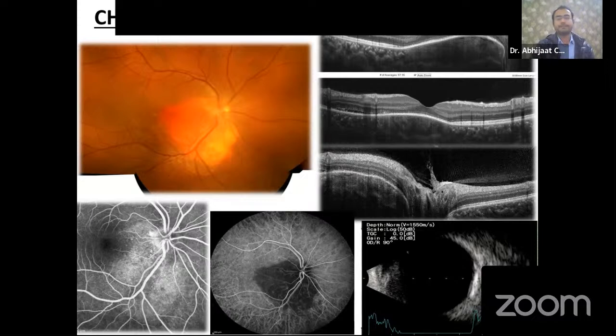staining in the late fundus fluorescein images, and calcification was also seen over the disc, and this large hypointense lesion just juxtapapillary to it. And on B scan, it showed a calcified lesion with presence of a pseudo-optic nerve sign. And since the patient is a young female and the lesion is unilateral, therefore the diagnosis of choroidal osteoma was made. And this case is very rarely encountered, therefore making this case a very interesting one.